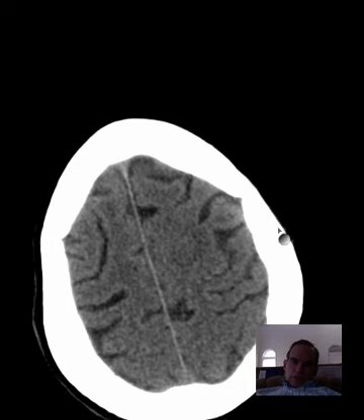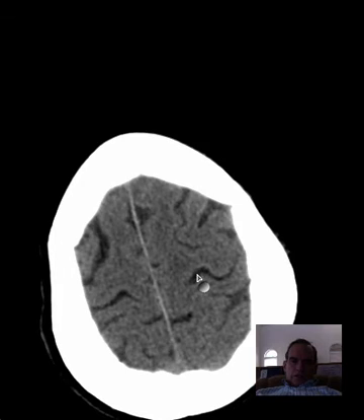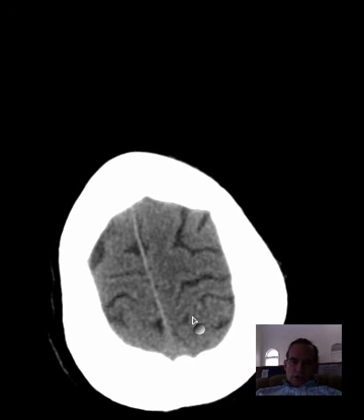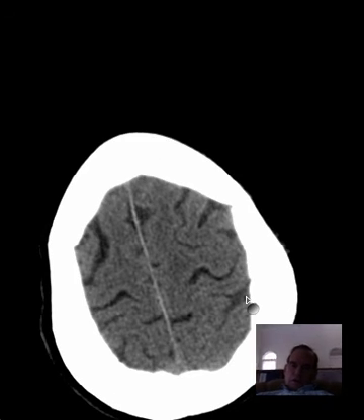And let's see if we have a cingulate sulcus. I'd say this is the cingulate sulcus right here, which makes this the central sulcus, which means that everything frontward of this is the frontal lobe, and everything posterior to it is the parietal lobe until you get to the occipital lobe, of course. So this cingulate sulcus is the gateway to understanding the lobes where they begin and end in the brain. So this is the cingulate sulcus.